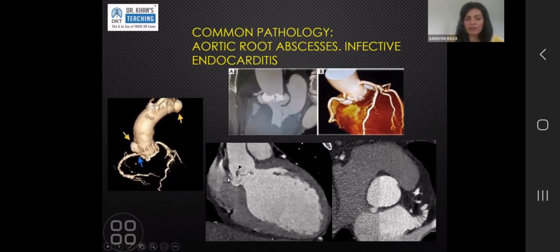These small outpouchings are described compared to which aortic cusp they are related to. So you would describe it as, oh, it's the right coronary cusp, and just under it there is an outpouching measuring this much. So you're describing it for the surgeon so he knows what he's looking for. When we do have pseudoaneurysms or aortic root abscesses, we try to do 3D reconstructions. It just puts it into context for the surgeon. Before the surgery, they can plan their surgery and their incisions accordingly.